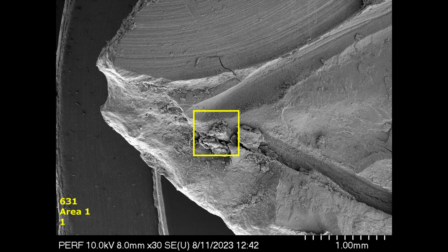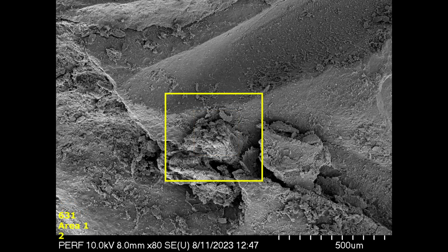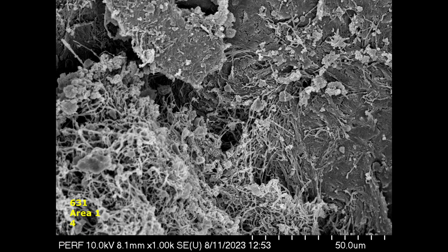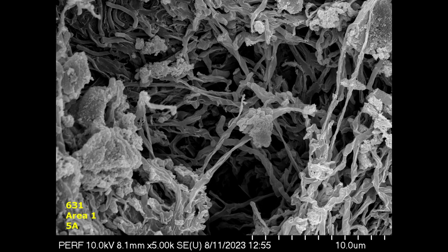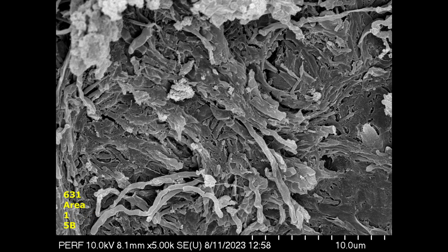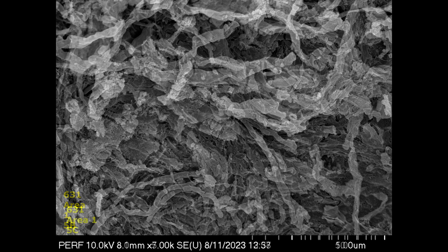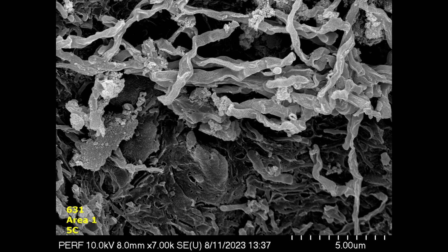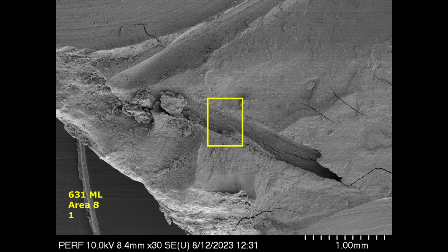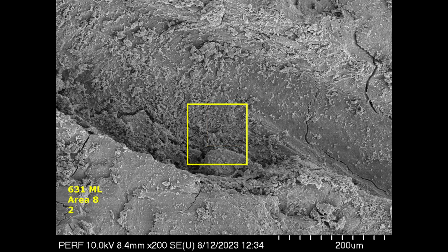And then when you look at the high resolution pictures and go into the terminus of the mesiolingual canal, you see there's some pulp tissue fibers, but if you look carefully, it's also a biofilm, quite a bit of bacterial morphotypes in with the collagen fibers of the pulp. So it was really just impregnated with a biofilm in the mesiolingual canal.